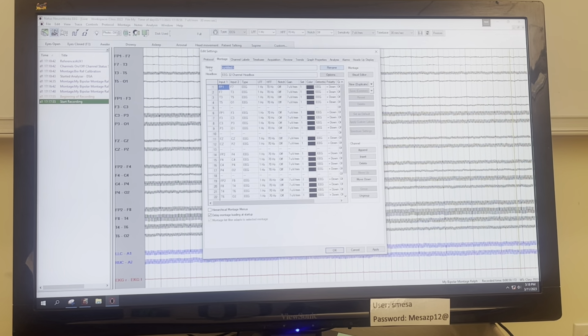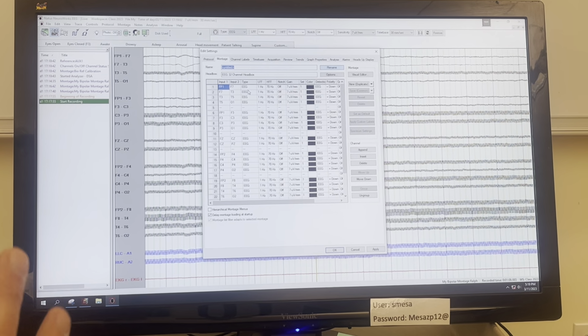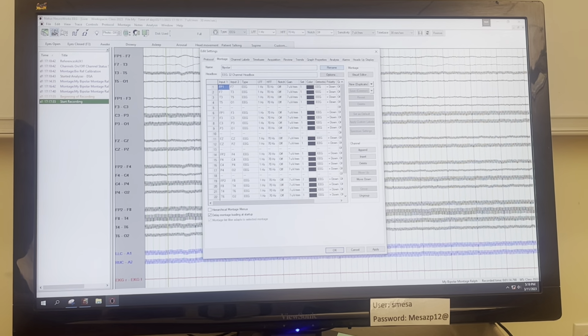Now it's going to be untitled. So now you can rename this montage specifically for this patient. Let's put bipolar montage, C4 out. Of course, you can name this anything you want.